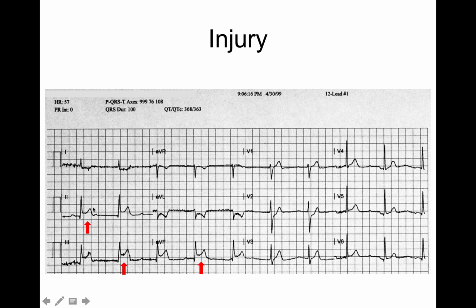Typically, we call this an RV infarct, the right ventricular infarct. These patients, you want to be very judicious with nitroglycerin, because if we wipe out their preload, we just decrease their heart. Not good at all, okay? So we have injury going on in our inferior leads, my septal and anterior and lateral leads, not too bad.